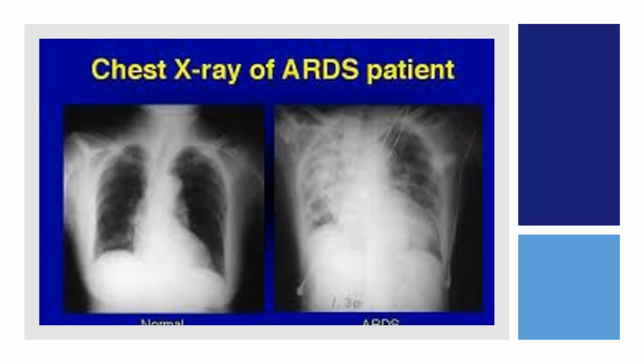Right? So one of the things that you'll be looking at in your critical care career, if you guys do critical care, is going to be ground glass opacities and ARDS, right? So this would be an example of a normal. You see how radiolucent or how dark this is. Here's your moguls, right? And then your lungs are looking good. Your cardiothoracic space is looking good. You have good CP angles.